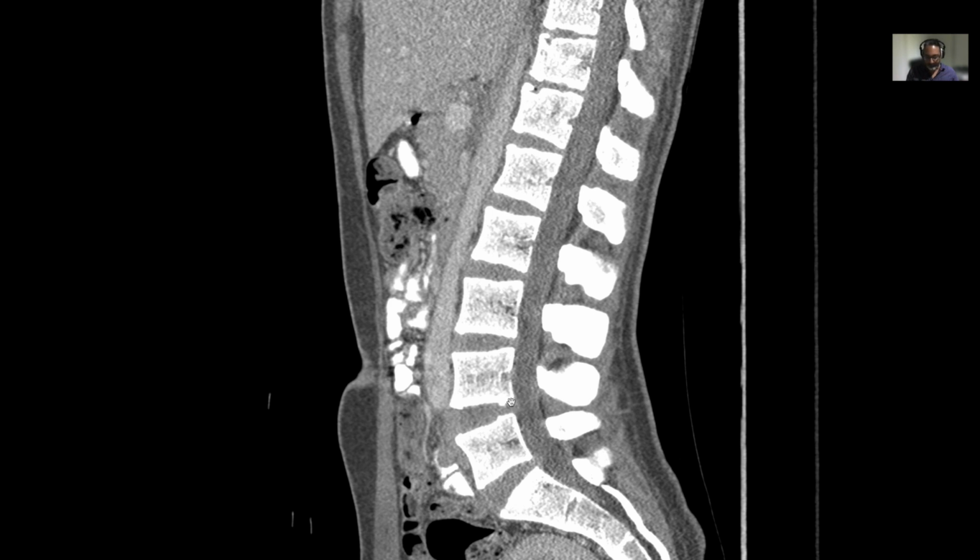Especially when you get to the L5-S1 level, there are a bit of disc protrusions, but they're normal, or even if slightly abnormal, they're not symptomatic. It's not something to worry about. Most of us will have these little protrusions, especially if we get into our 30s or 40s, they start to develop. So you can see a little bit of protrusions here and here, and if there are no symptoms, there's nothing to worry about there also.